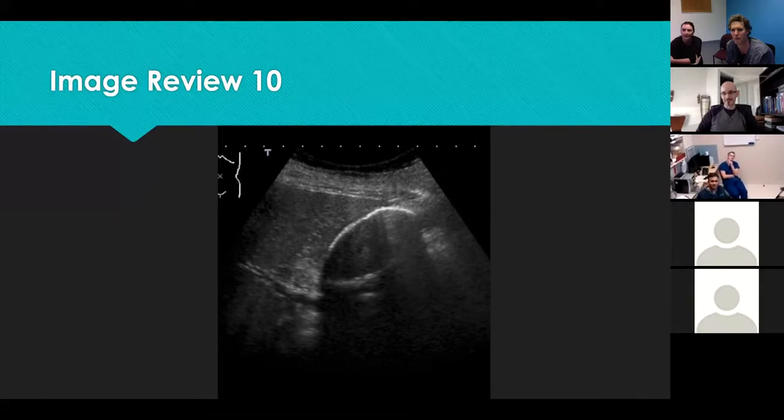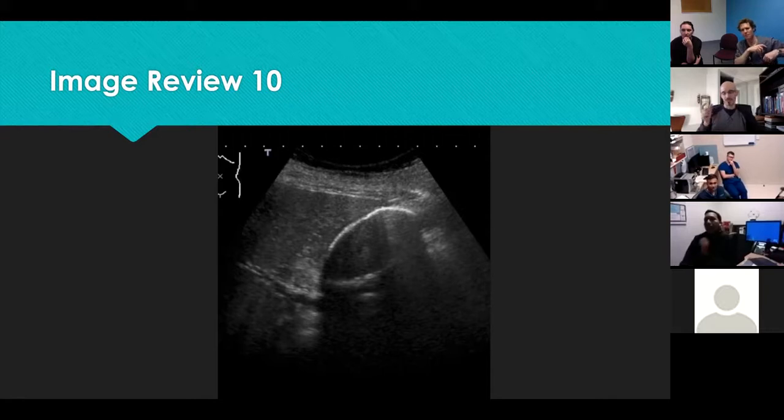In terms of documenting the images, what is the minimum number of images required, or the most optimal number of images, and what planes are required to document a full study? It depends. For emergency DDU, whenever I document images, it's about 40 images or so. But if the requirement, as Sam said, is CCPU-type images, then it's going to be one image of the liver to show that there is no intrahepatic duct dilation. That would be one sagittal and one transverse.